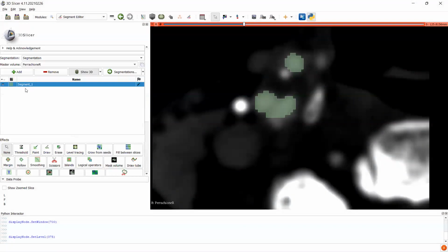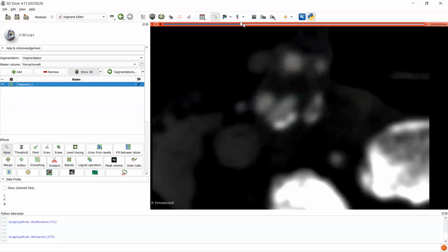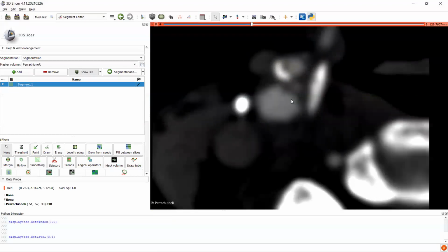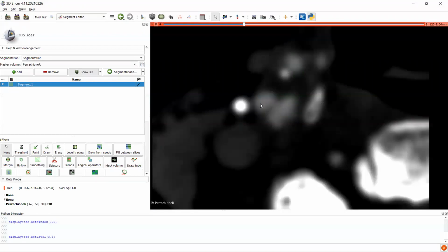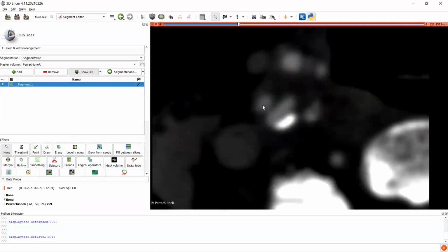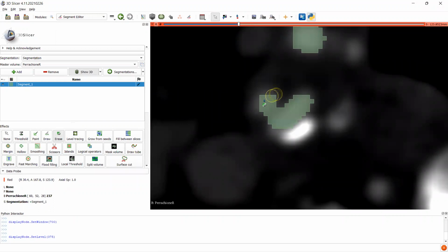There might be something we can do to mitigate this. I could just cut off this side. That's pretty clearly flow lumen, so I don't really want to mess with it. Which means that bulbous region, we might just have to keep that, even though it doesn't look pretty. Here we might be able to remove some of that.